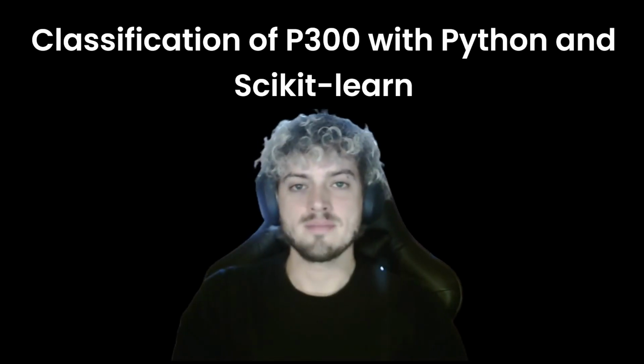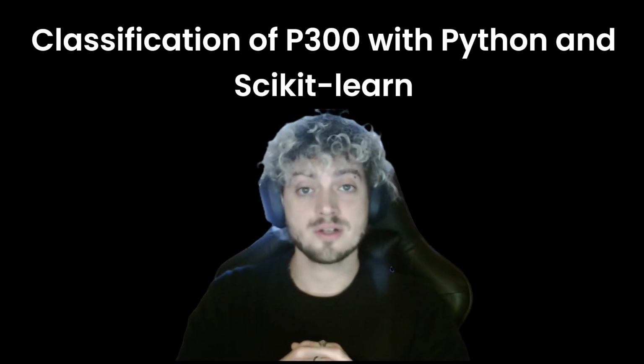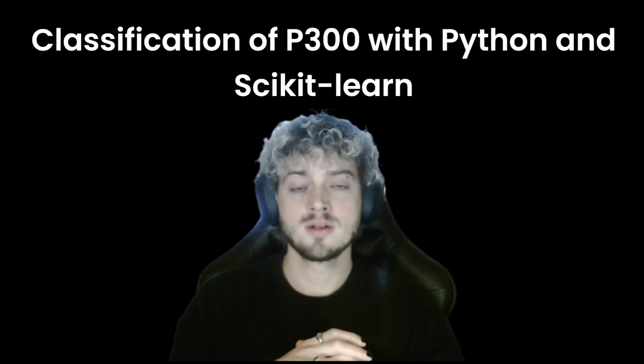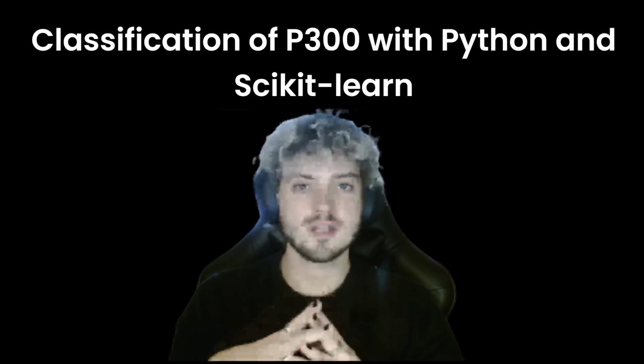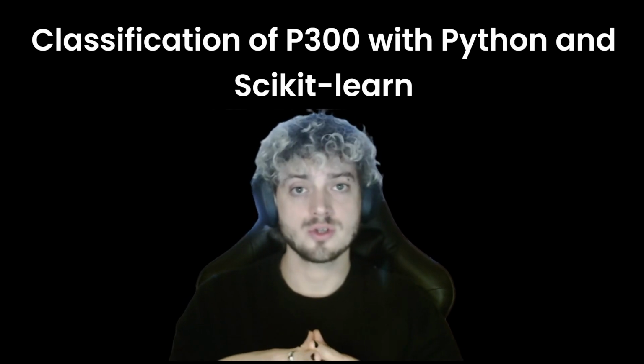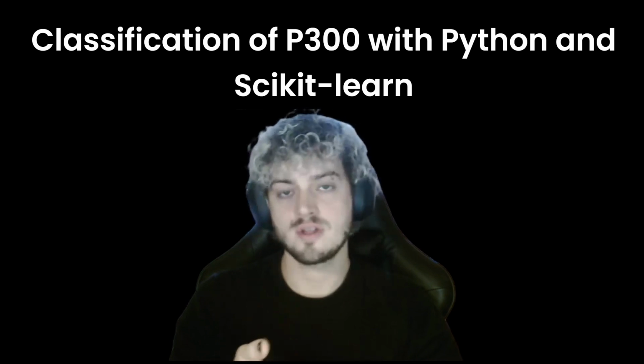Hello everyone, I'm Mike, and this is the second video in my series on analyzing the P300 in EEG data. This video is about the classification of P300. Specifically, it's binary classification: whether there is a P300 or whether there is not.